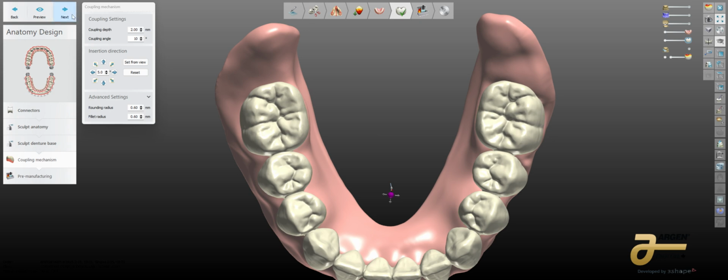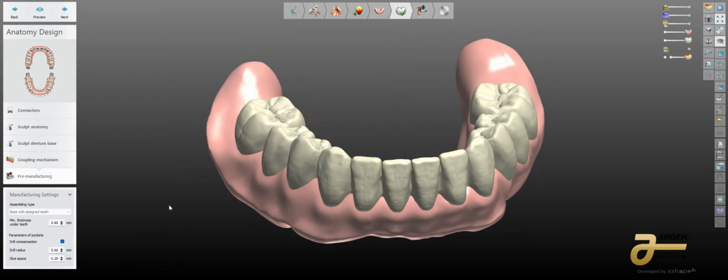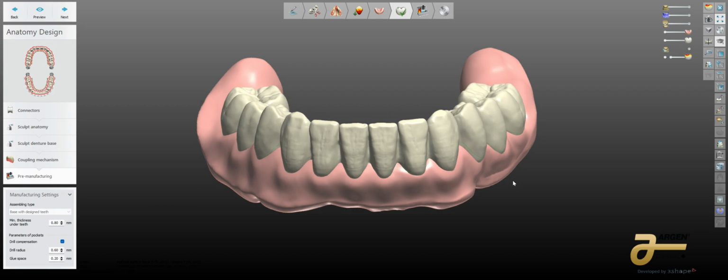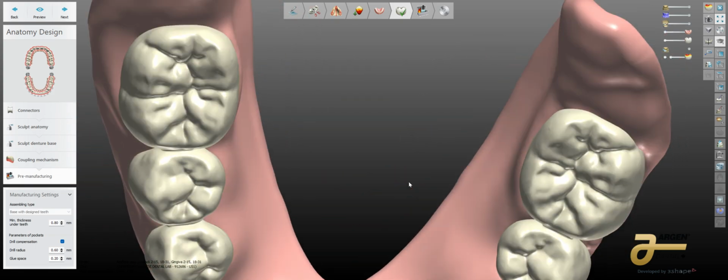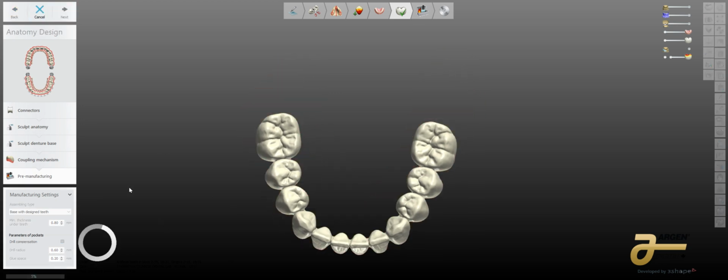I'm going to go ahead and click forward here again. And again, what is this? 30 minutes of video, 40 minutes, less than an hour for this. And I'm talking as we're going over all this stuff. I generally can do these cases in under 30 minutes, and to do them to a level that I'm proud of. There's a couple things here that aren't absolutely perfect, but I'm yammering on and not doing my normal things, but it's pretty close. So again, let's finish this sucker up real quick.